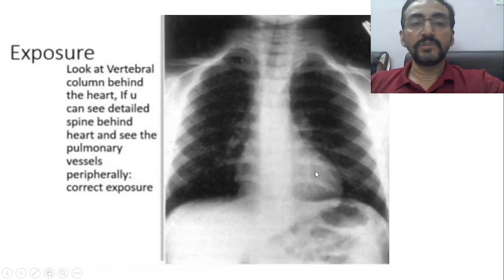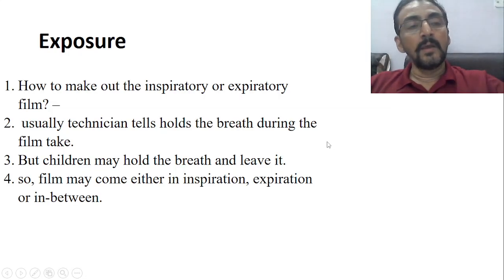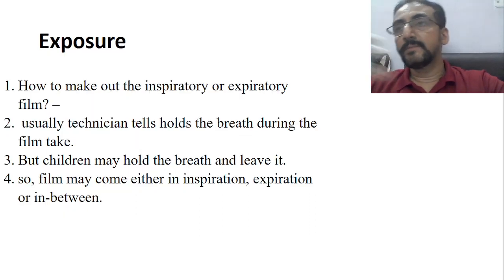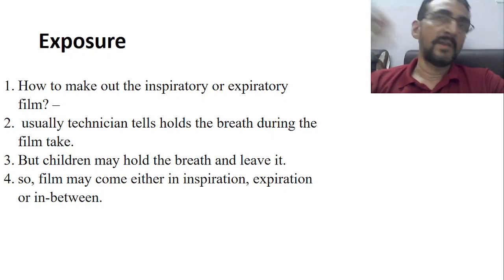Good exposure. Another important thing is how to make out an inspiratory or expiratory film. Now, when the film comes to your hand, you should be in a position to tell whether this film has been taken in the inspiratory phase or the expiratory phase, isn't it?